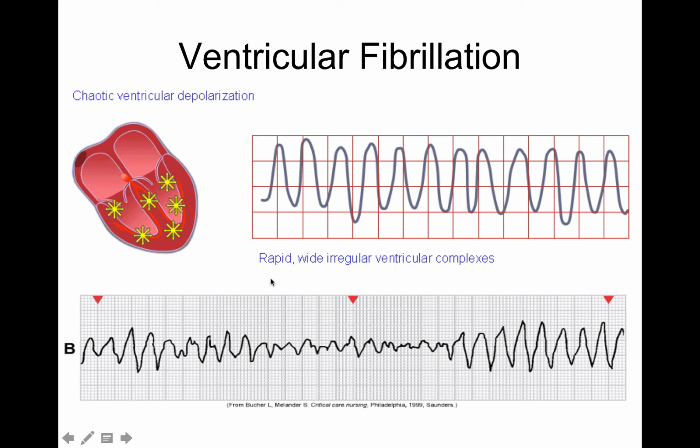So you see ventricular fibrillation. Ventricular tachycardia is uniform, while ventricular fibrillation is kind of all over the place. We have coarse and fine VFib. We're not going to go into details for this, other than that fibrillation is where the ventricles are quivering from the focus, and it's not good at all. The first thing we do to treat this is CPR, CPR, CPR. We get IV access, and we're going to prime the pump before we do any defibrillation.